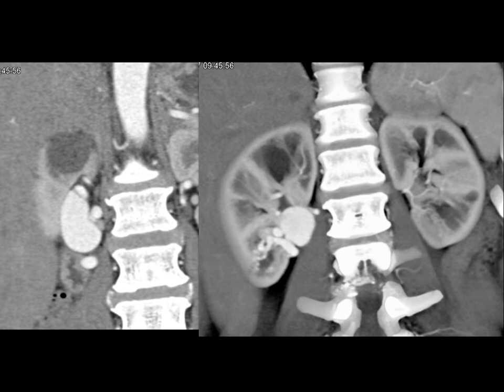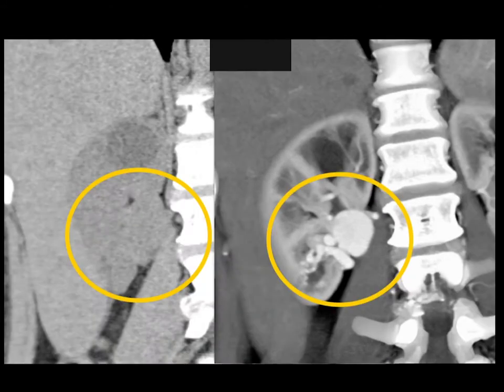And you go back and you say, well, where was it? Well, there it was in the mid to lower third of the kidney immediately, but there was no differential density, so it didn't show. And here it is again, side by side. Even in retrospect, you would have to be a wizard. You'd have to be the wizard of CT non-contrast scans to be able to see there's something there and say you have an AV malformation.